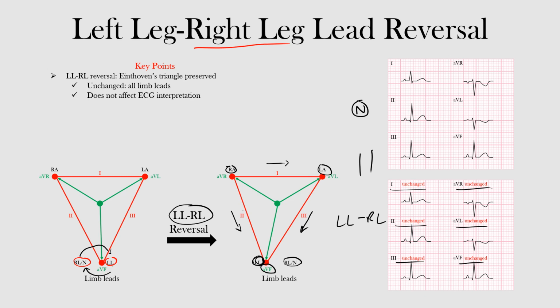So pretty easy here. So then how do you spot this sort of lower limb lead reversal or lower limb electrode reversal, okay? Well, you really can't, and more importantly, it won't change your EKG interpretation. So it's really not too difficult, and hopefully that makes sense why nothing's changing. So let's review what we discussed before we end here.